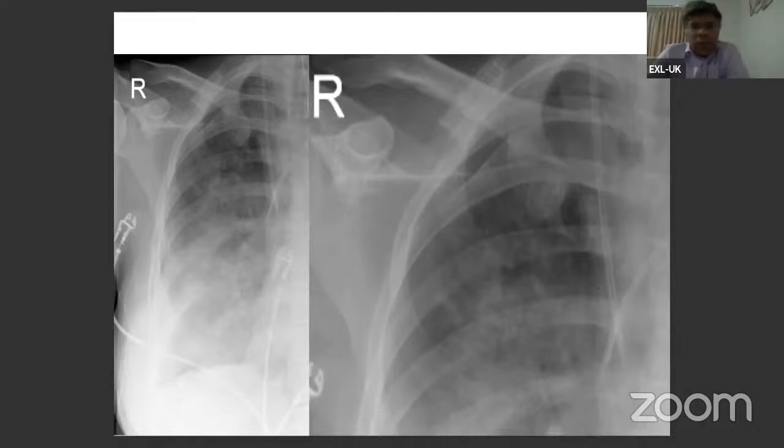So again, pneumothorax, as I was just reading up, the complication rate of central lines is about 5 to 25%, and it's actually 1 to 2% that you can have a pneumothorax after a central line placement. Dr. Afsar is showing that pneumothorax line over there. So we have to be very, very careful. But these things do happen. That's the most important thing.